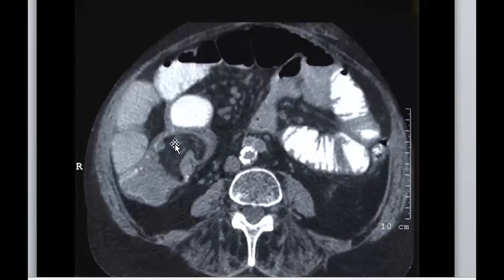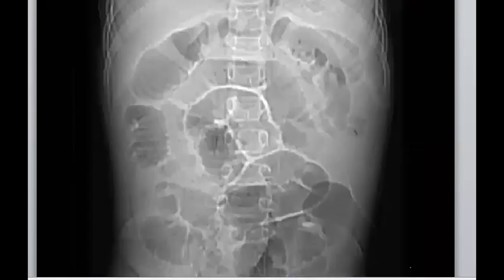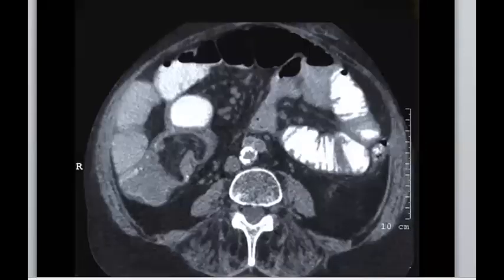Yeah, lipoma. And what happened here is that it is intussusception. Perfect. Yes, Marwa. So go back and see how it is. It's not very easy, but at least you can suggest small bowel obstruction. And I agree with you that it is most important to mention as a negative whether there is free air or not. After that, surely the surgeon will ask you to do CT, and if you did CT, you will find the mechanical cause here, which makes the intussusception.